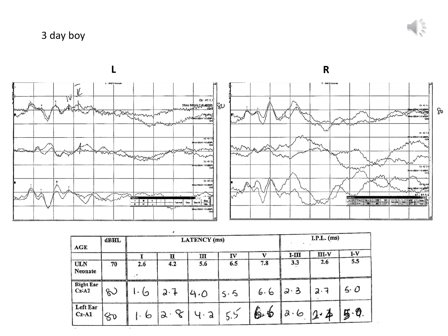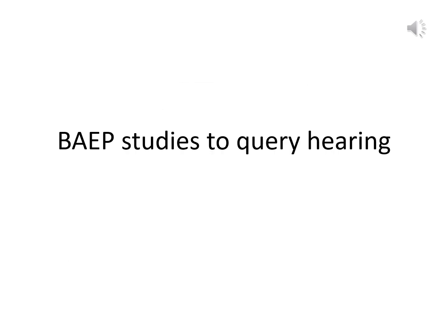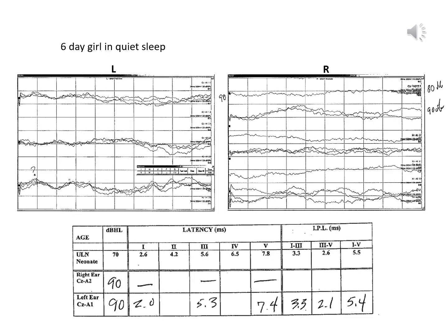The following are a series of studies where the clinical question was to query hearing. This is a brainstem auditory evoked potential in a 6-day-old baby girl. Now we're told right off that these recordings are done in quiet sleep, which is a really useful piece of information for us to receive.